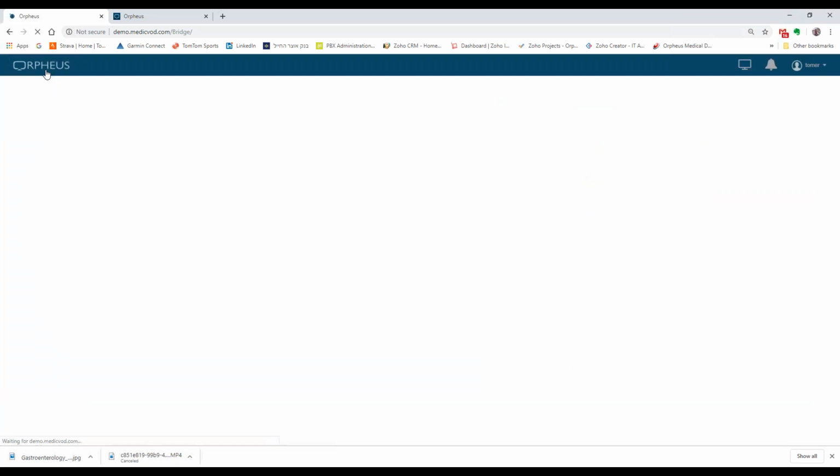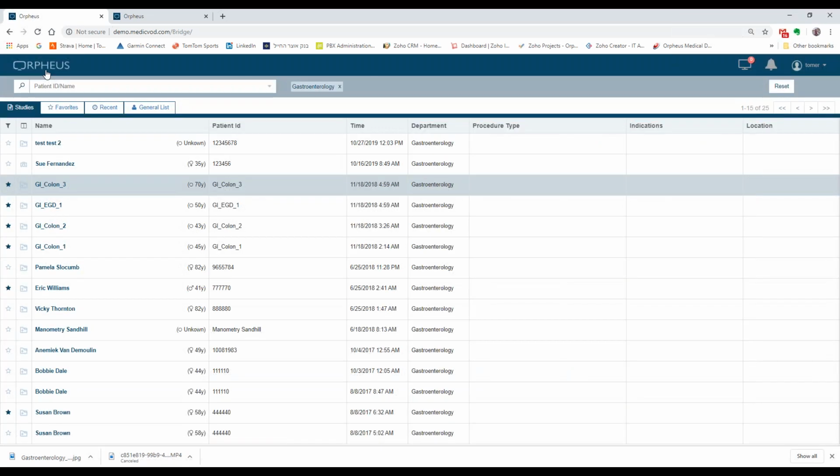Just one quick question on that, Tomer. So that image has to be manually transmitted then, if needed? It doesn't automatically flow to the EI? Correct. At the moment, we don't have that ability to auto send. Okay. Actually, in a later version, we might have the ability to auto send images based on the creation of the image. So this image was created, it's a trigger in the system, and it can be auto sent. I'll follow up on that for you.